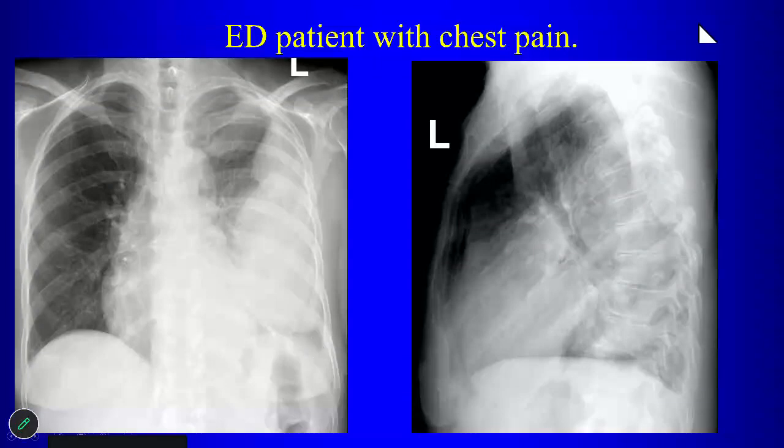Okay? So this patient shows up in the ER with chest pain. You're on chest this week. What are you going to say? So there's an opacity in the left lung, kind of around the left pleural surface. It looks also nodular. So I'd be concerned for like empyema or maybe some related collection. Okay, so you think that this is a pleural lesion, right?